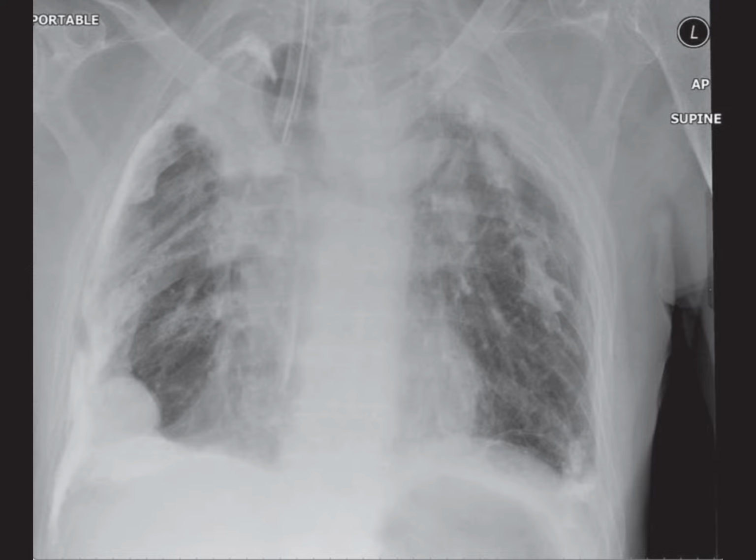In post-primary TB, the radiographic findings typically include fibrosis, bronchiectasis, and pleural effusion. The fibrosis and bronchiectasis seen here, especially with the extensive pleural calcification, are consistent with a post-primary TB pattern. TB can also affect extrapulmonary sites, including the genitourinary system, bones, joints, and gastrointestinal tract. Understanding these findings is crucial for patient management, as TB remains a significant health issue worldwide. Proper isolation and treatment are key, especially in infectious cases.